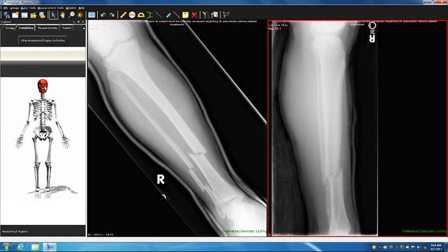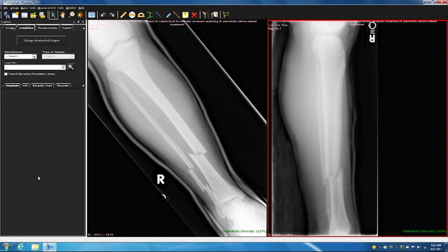Within TraumaCad, there are somewhere over 400,000 implants or something ridiculous. They're all based on the CAD drawings that the machines use to design the implants, so they're very accurate. The skeleton man allows you to limit your view to things that would apply. So I'll click on his right diaphyseal tibia, and that will just limit my implants. So now we're actually within the program here.